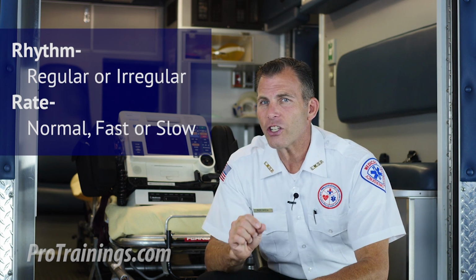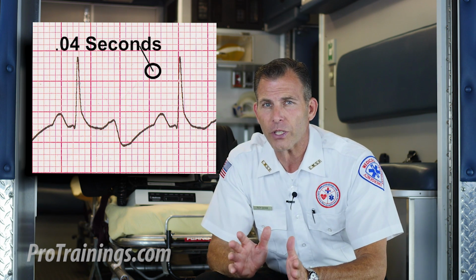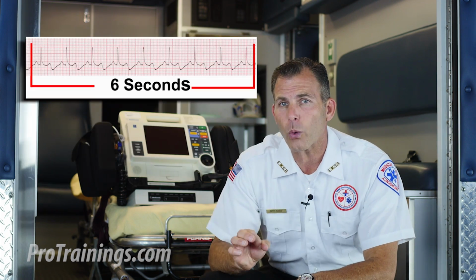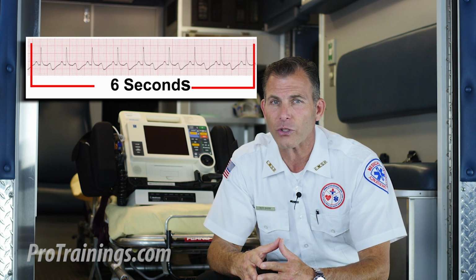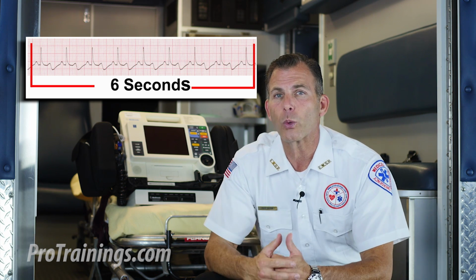Now remember, ECG paper grids are where time is measured along the horizontal axis, and each small square is 1 millimeter in length and represents 0.04 seconds. Each larger square is 5 millimeters in length and represents 0.2 seconds. So, a 6-second interval would be 30 large squares. To determine heart rate, count the number of QRS complexes over a 6-second interval. Multiply by 10. This method works well for both regular and irregular rhythms.